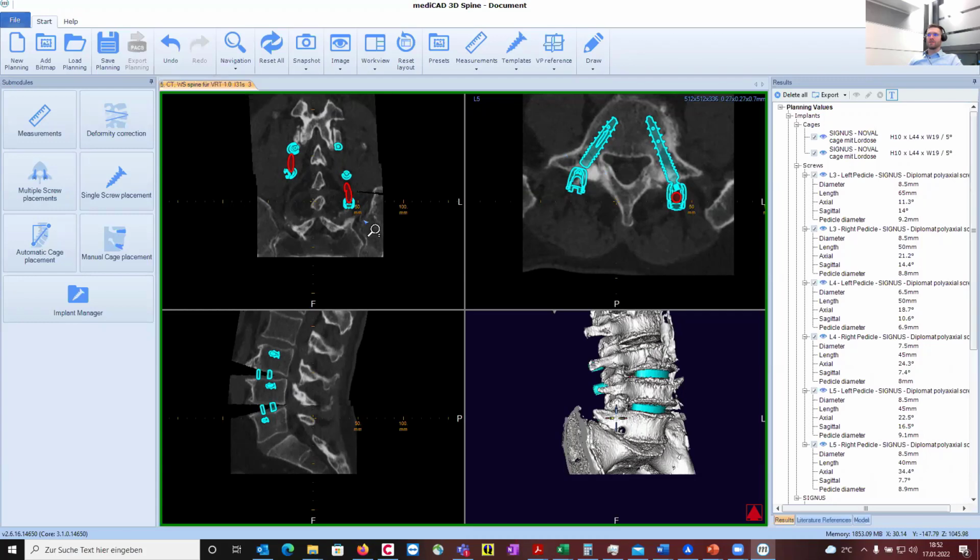So any questions till now, or any questions about the functionalities you've seen so far? I hope this case or this fixator intern case is okay for you. Or did you expect something different to see?